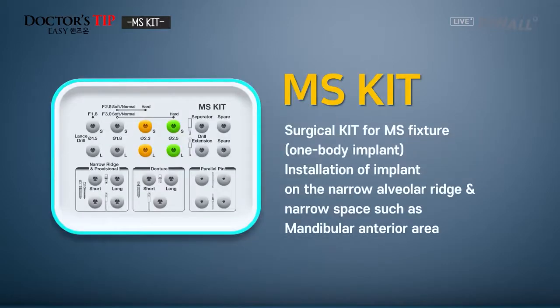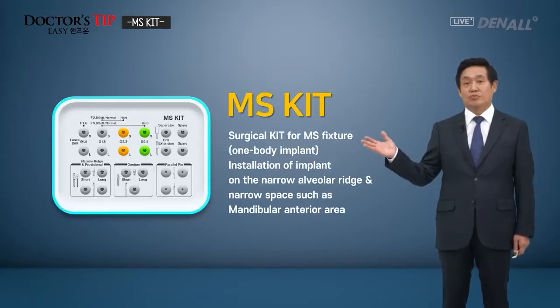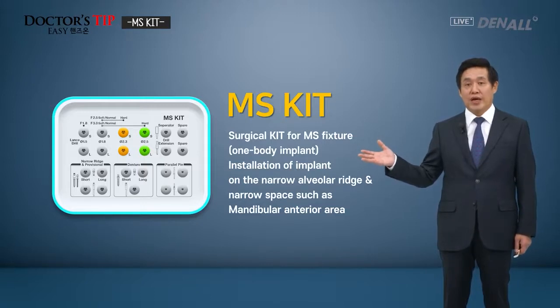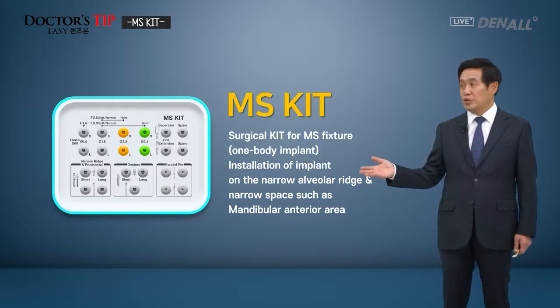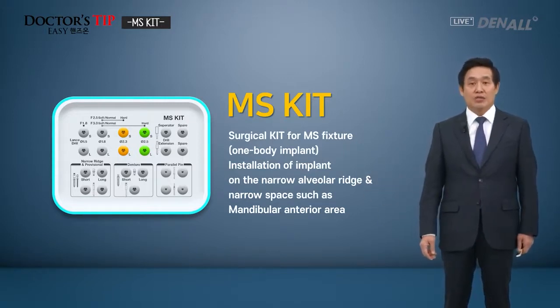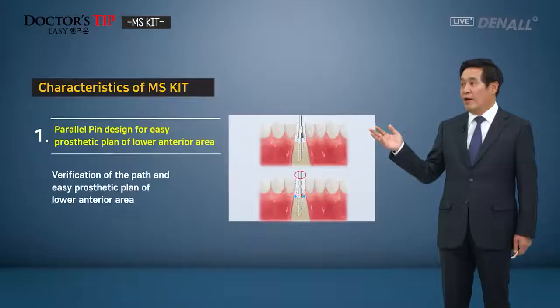Today, I'm going to talk about MS Kit. MS Kit is for the mandibular anterior side, narrow ridge, and if there is a small space, then you use the MS fixture, the narrow implant from Osstem, and it's a one body implant, and this is for such purpose. So what are the characteristics of this kit?